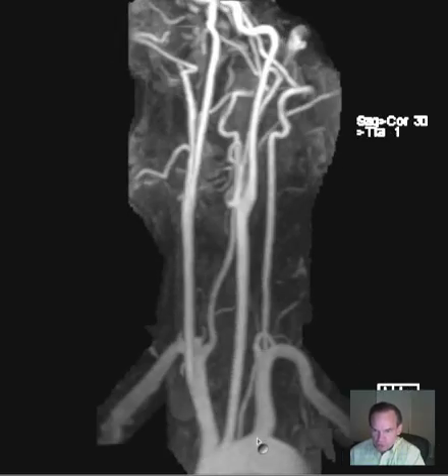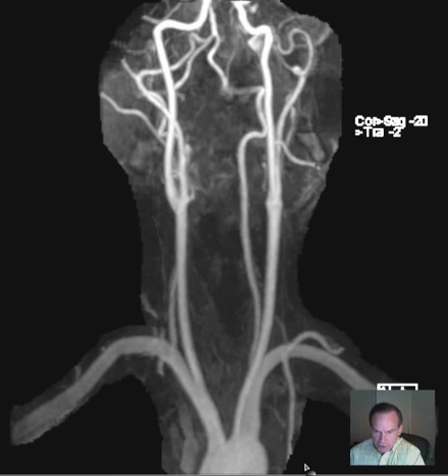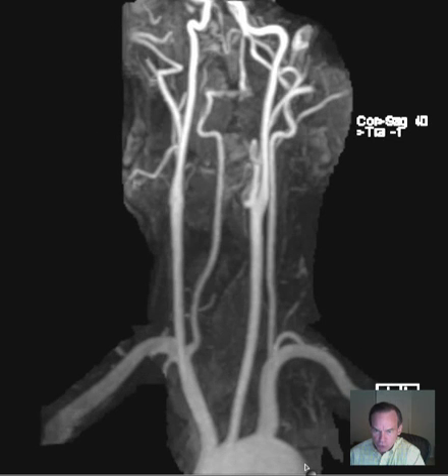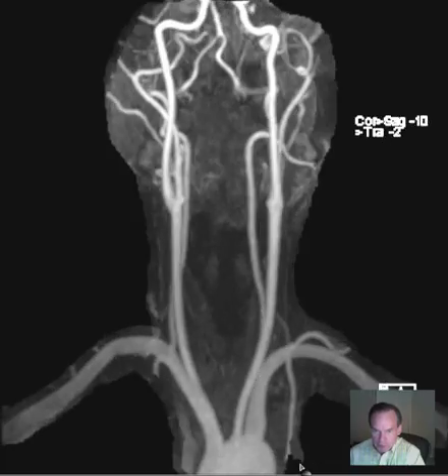So there is shortening of the apparent width of the arch in the AP plane, and you get a more true view of the diameter of this arch on this oblique view. So here we have the great vessels.